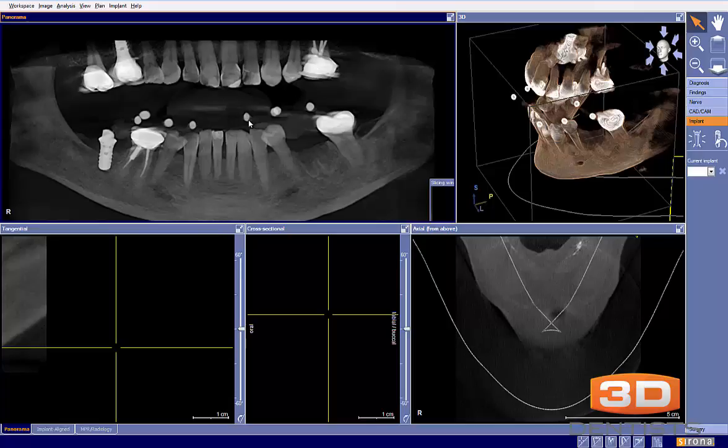All right, we've got another case here, and the notes on this particular case are: tooth number 19 was extracted 8.5 months ago prior to the cone beam scan and was grafted at the time with a 50/50 mineralized corticocancellous bone and collagen membrane by another practitioner. What is your opinion of the site on the scan for implant placement, bone density?